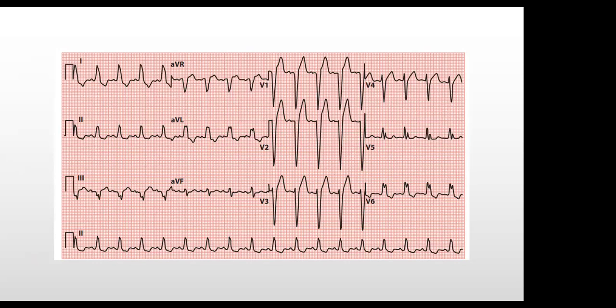What do you think? Okay, this is a block. We've done this before. Let's just leave it out.